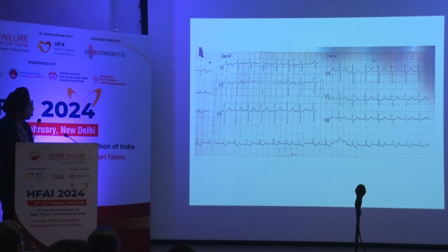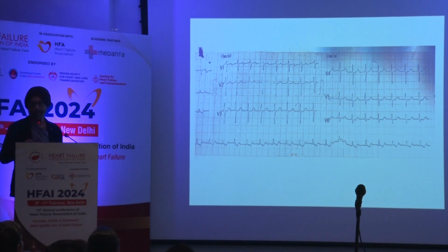Okay, I don't have a question here. So, does anybody want to come up and try to analyze this ECG? Because I know the diagnosis and we have done everything. And somebody should come up, or I'll ask somebody to come. Who wants to give it a try? It's always a good thing to do that. You're not going to be wrong. We'll help you.